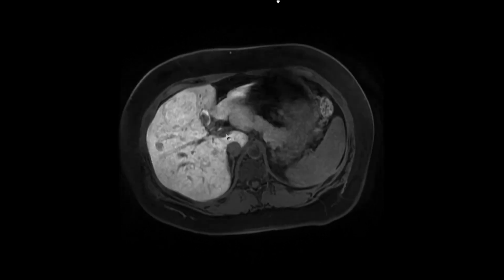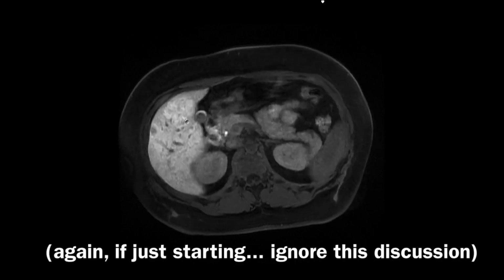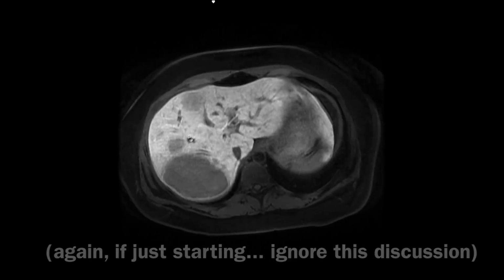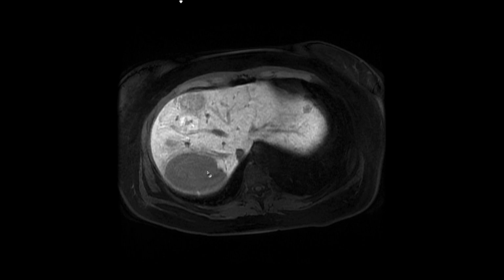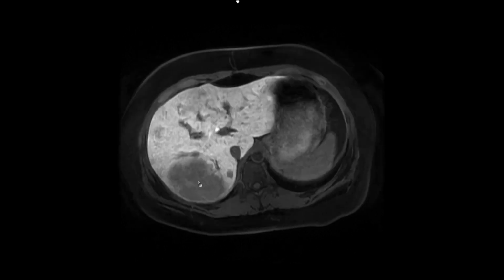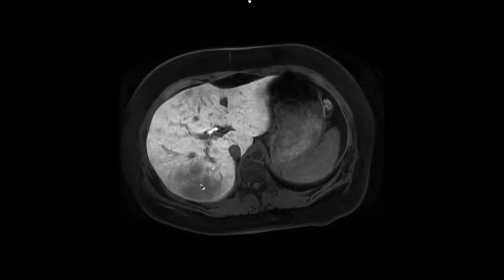You'll also notice that some of these lesions, namely this lesion down here that was quite isointense, had a central T2 hyperintense scar, takes up EOVIST quite avidly, as well as this one up here. And all these other ones don't, especially this one posteriorly here that was quite T2 hyperintense, was heterogeneously enhancing on the arterial phase, and takes up no EOVIST.